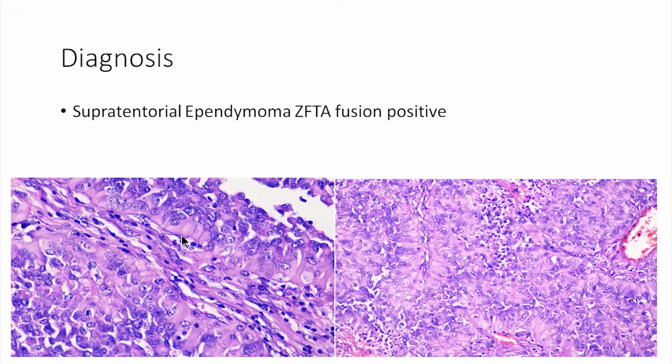Again, there is one morphological variation which is papillary ependymoma, which looks like this entity. But we can see the reverse polarity around these vessels. The tumor cell nuclei are present away from the basement membrane. So this reverse polarity arrangement, with abundant cuboidal or columnar appearance around the vessels, gives rise to the papillary arrangement. They show typical EMA positivity, Olig2 is negative, and they also show D2-40 positive. That is, podoplanin is also positive.